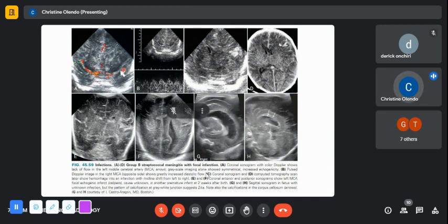Or there's no flow, because one can actually zoom in and show there is no flow. You can zoom in and see something echogenic within the vessel, and then you can look at the area of blood supply and see if there are features of infarction, because then there'll be changes in the echo texture of that blood supply. The gray-white matter differentiation will be lost.